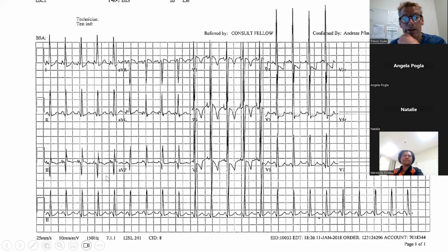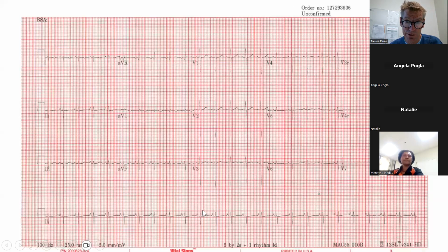Okay. So this is an ECG of a child who's got left ventricular hypertrophy. And as I said, the causes of that could be many things. You can't say what the cause is, but you can say what part of the heart is affected just from looking at the ECG. And then usually what you want to do is obviously take a history and do an examination and see if there's any murmurs and see what the blood pressure is. And you can put it all together and really get a good picture of what part of the heart is most likely to be affected.